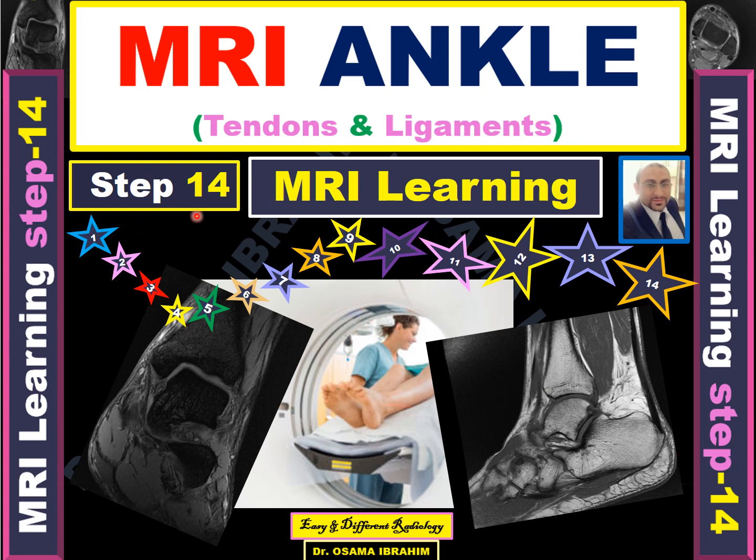Today, our appointment is with step 14 from the MRI Learning lesson. I will talk today about the MRI of the ankle, tendons, and ligaments. So let's get started.